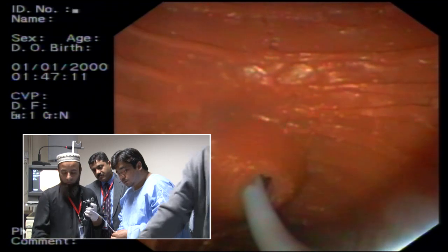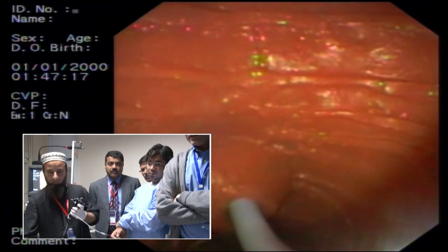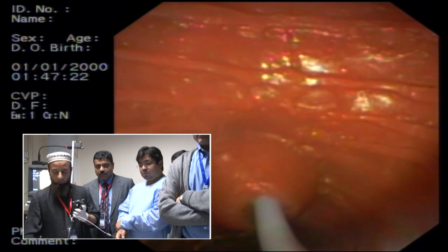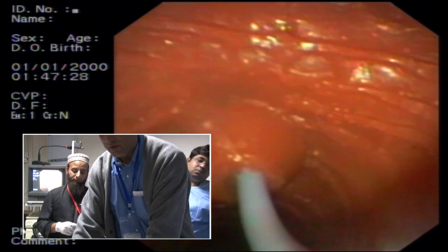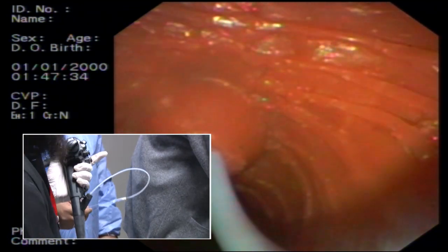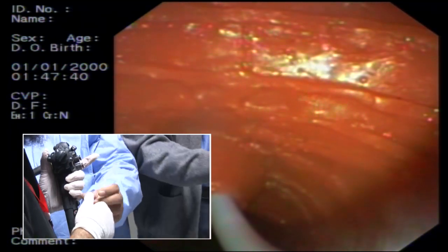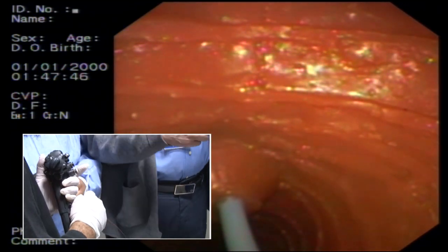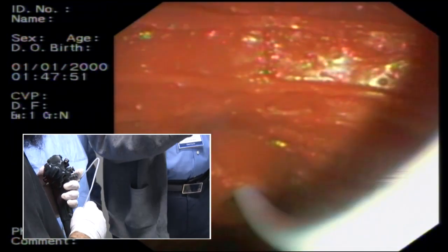Now you just pull the scope back a little bit, just a little bit, and see what happens. If it operates the way the patient would. Small wheel away from you a little bit. Small wheel away from you, and that sometimes can strip. मेरा ख्याल है ये जो है just do what pulling back does. थोड़ा सा pull back. You understand you can actually do it more than if you combine pulling back and up wheel. Really, for most cases, you really don't need to use the elevator.